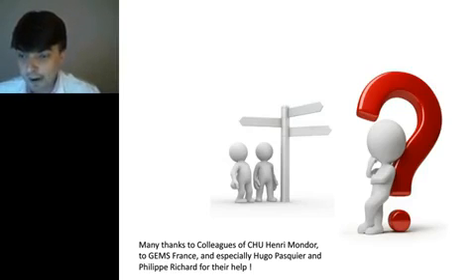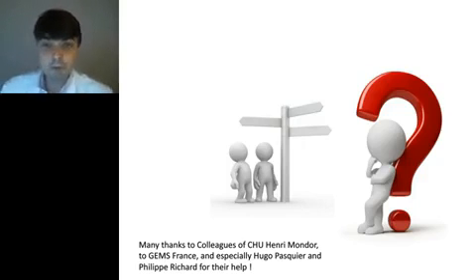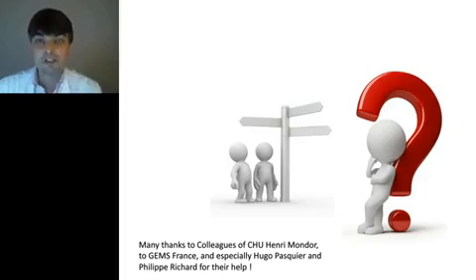I've got a question here showing, shouldn't iodine water maps illustrate only iodine? Shouldn't bone structures be suppressed in iodine over water map images? Well, do remember this is not actually a reconstruction based on the actual Hounsfield unit. It's based on the behavior of those lesions that do have different atomic numbers. So, of course, you will have a decrease in the way the bone is represented, but this is not iodine.